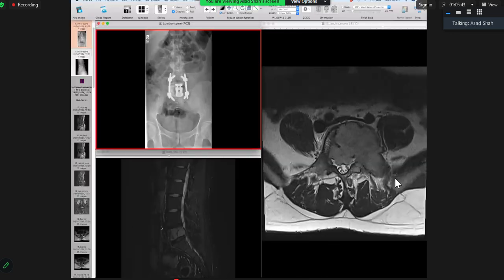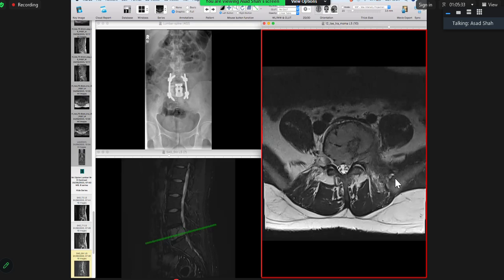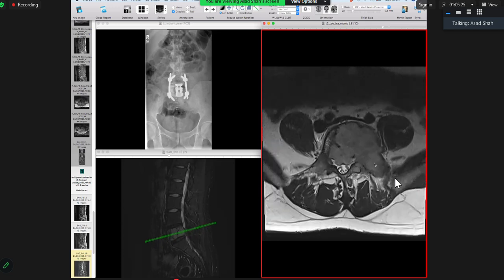So yeah, and if you look here, look at that. This is the transverse process, the iliolumbar ligament there. And this whole thing, the tumor is going all the way down there. I mean, it has got epidural spread, but the cauda equina nerve roots are not corroded. All right, it is causing significant encroachment into the foramina and that's causing pain.